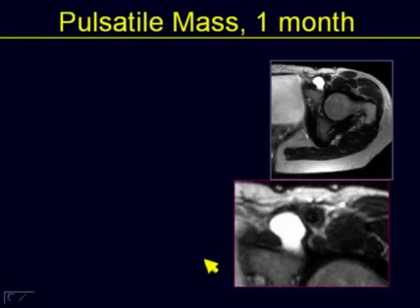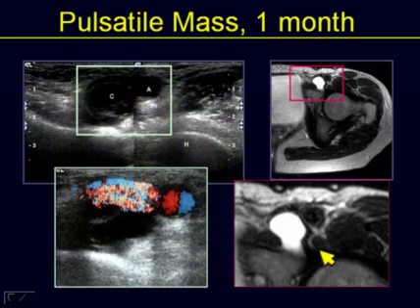Here on the left hip of a patient, on a T2 axial view of the hip, you'll notice the femoral head and then the acetabular fossa. Here on the anterior pillar of the acetabulum against the femoral head is a distended collection of signal aberration that represents the bursa. Note that it is in the proximity not only of the great vessels but also of the iliopsoas tendon. This pulsatile mass that was present for a whole month is seen on ultrasound as a hypoechoic lesion.